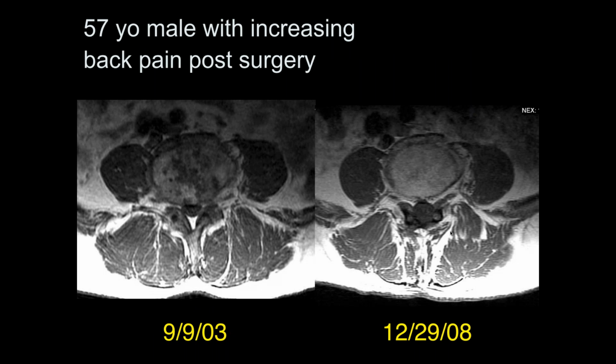57-year-old, increasing back pain post-surgery, 2003, 2008. So in the 2003 study, we see narrowing. That's a T2, I think, right? I guess it could be a T1. Okay, well, I don't know if it's T1 or T2. So I can't really say how narrow the canal is. It seems pretty narrow, but anyways, there's been laminectomy.